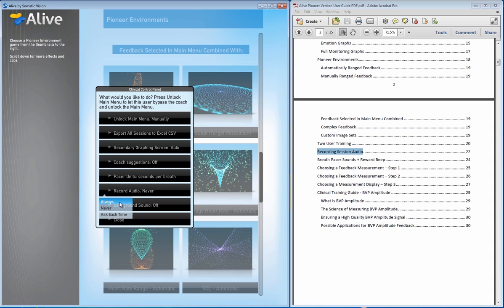So that, for example, when in progress review, in the clinical single session review, you're reviewing a session, you can jump around to different parts of the session and listen to what you, or if you're working with a therapist, what a therapist said right before, after, or during some kind of event that you see. So if you were training skin conductance, you see a huge spike, you can see what was said right before that.